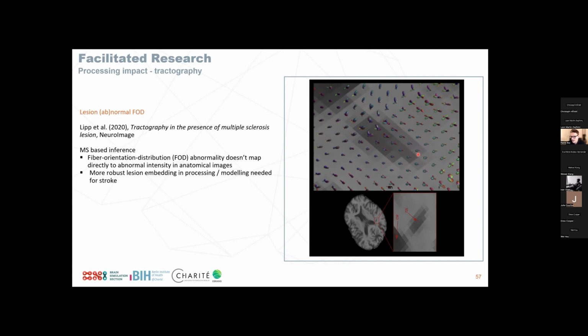But we've also known, and we've seen this before, that the temporal dynamic of the lesion itself will most likely end up, at least in the stroke case, with a lesion that is still present here. As you've seen, these chronic cores still persist longitudinally, but all of those voxels will be back to their normal intensity values, so will be considered a healthy brain again. And this kind of supports this hypothesis: if we actually look at the probability distributions of those fiber orientations, they are still very much in line with neighboring voxels.